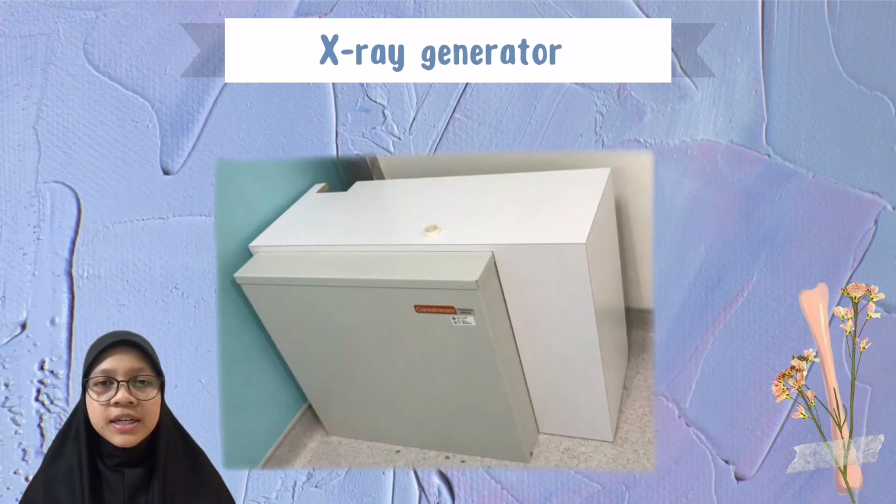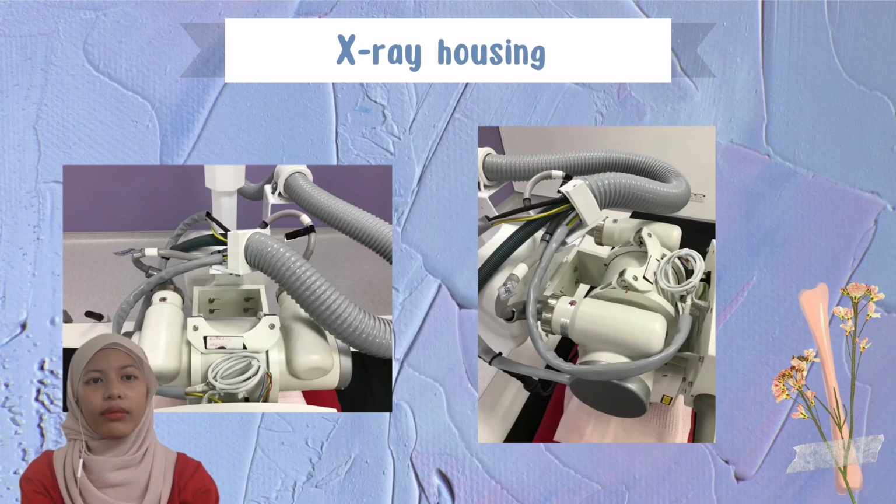The X-ray generator delivers the electrical power to energize the X-ray tube and permits the selection of X-ray energy, quantity and exposure time. And this emission rate is specific to a generator and X-ray tube target and housing. The X-ray housing is needed to protect the outer space from the leakage of radiation.